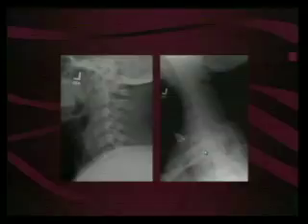Those look okay? What about our anterior longitudinal line? Okay, so let's follow it down, follow it down. Well, maybe it's just because he's got all this degenerative change. So let's look at the posterior.